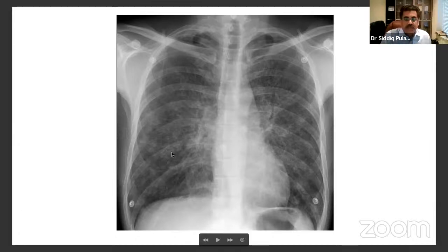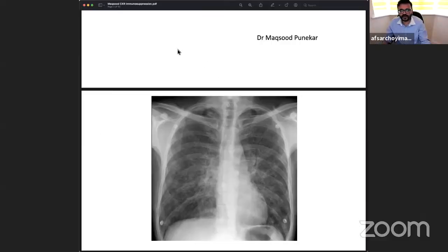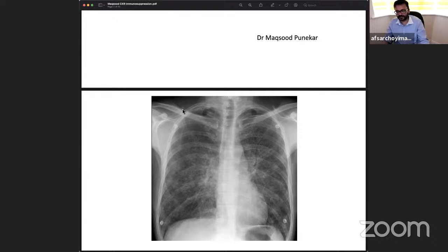Again, some of the lesions most people miss are on the ribs. Do you have your own personal way of looking at the ribs? I think we will come across one case in the next session. We have already seen two cases, sclerotic metastasis and a lytic lesion on the ribs. We'll discuss that in the next session. Okay, excellent, very good.